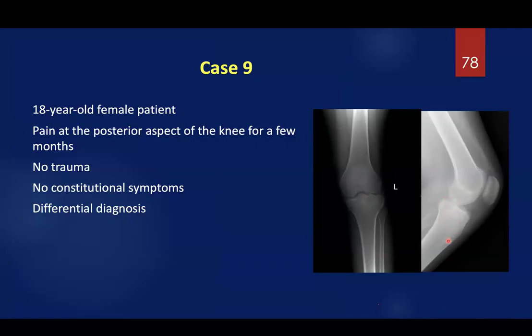So to me, this is a benign aggressive lesion because I can see the borders here of the lesion. So it's benign, and I see neocortex over there. And if you concentrate also, the epicenter is in the epiphysis.